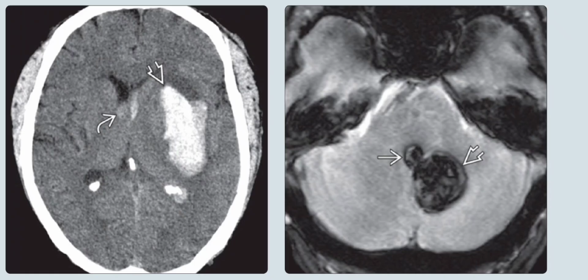Left image is the axial CT scan, and it shows a hyperdense hematoma centered in the left external capsule and putamen with associated edema and mass effect, as well as intraventricular extension of the hemorrhage. This is the most common location for a hypertensive hemorrhage.